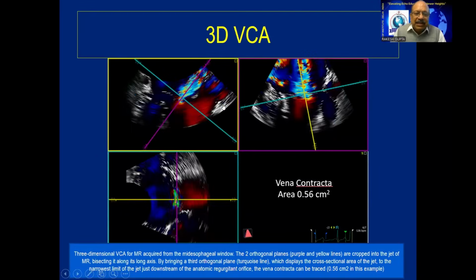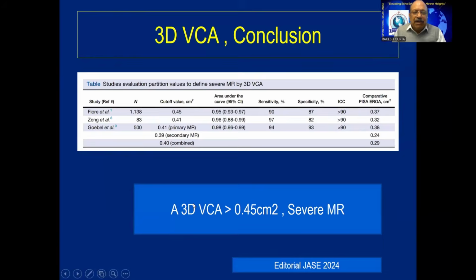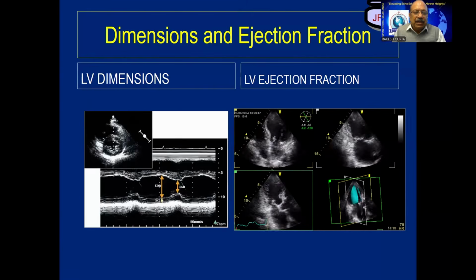This is our second approach: I can go in 3 dimensions for vena contracta. Now this is easy. I can go to a loop and calculate the width as well as the depth, and I can calculate this vena contracta in 3 dimensions. And believe my words, the most important thing, if you can do it correctly, is the things I've told you.